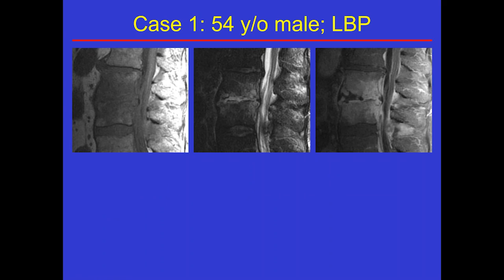Let's take a look at our first case. This is a 54-year-old male with a history of low back pain. Give everybody a few seconds to take in the images. We've got T1 images, T2 images, and T1 post-contrast images.